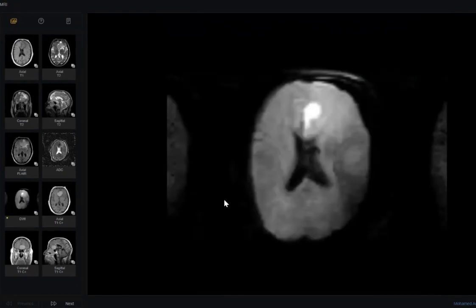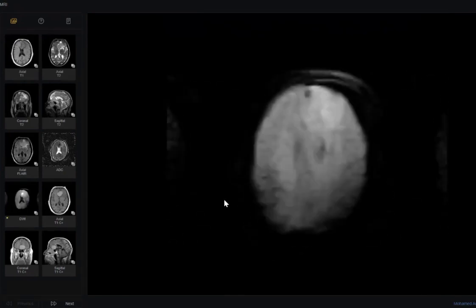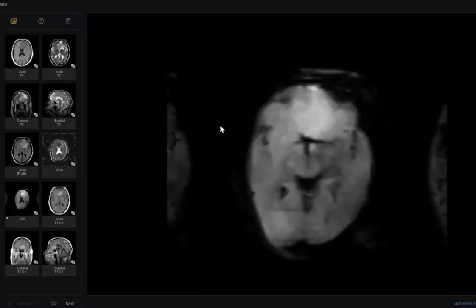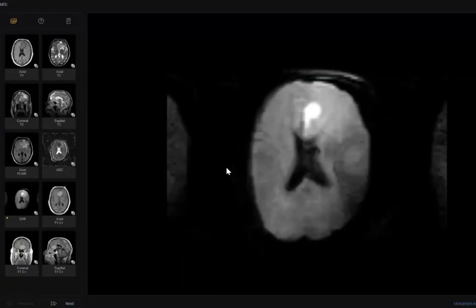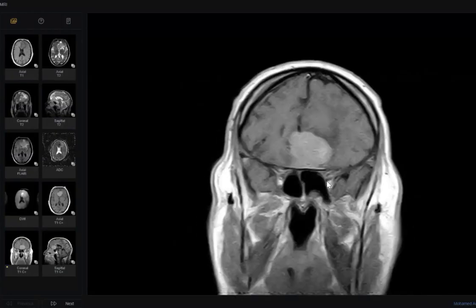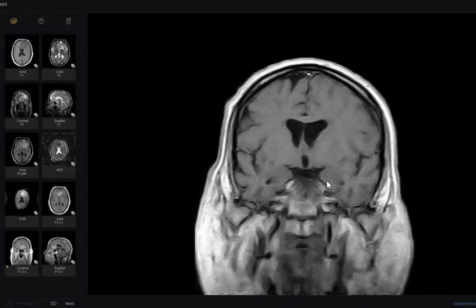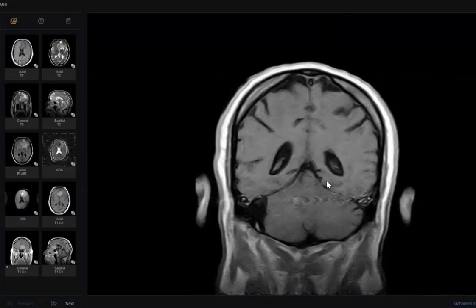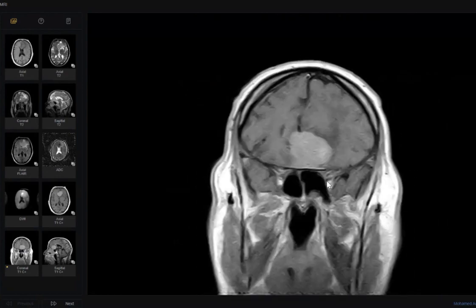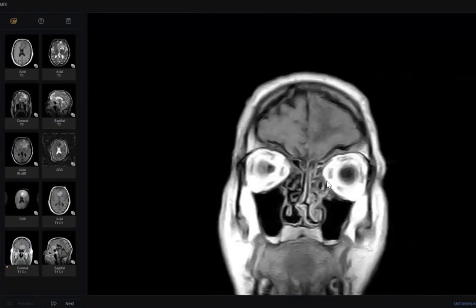What's your diagnosis? Most probably associated hemorrhage. Are you sure? Doctor, the lesion is this one. We are above the lesion. Okay, so yes, there is an ACA territory acute infarct. Yes, this is the point of this case. Take care, the examiner must assess you, so he must trick you. This is his business. This is his duty.